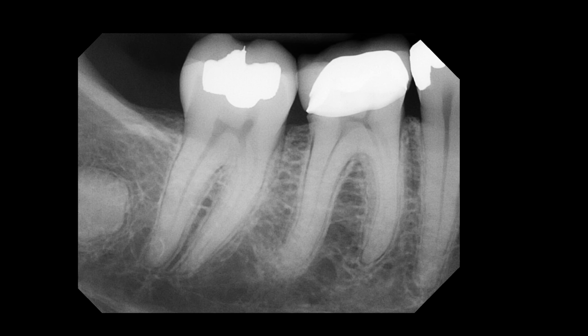Hi everyone. So today we're looking at a periapical radiograph of a 37-year-old patient who had a CMS, or complete mouth series, taken at our school. I have already reviewed the full CMS and have noted that the patient is missing the rest of the third molars, 1, 16, and 17. But if you look at this area, clearly at the site of missing number 32, there is a relatively well-defined radiopacity.